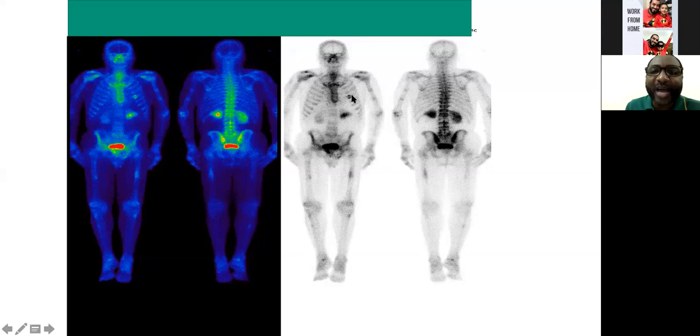And you will hardly get fracture in one single rib. Usually fractures are multiple and they are in the costal region, but this is slightly elongated. So I will raise the suspicion, and then with the addition of other similar lesions, I will raise the possibility of metastasis. And also this one of the femur, it is also oblong.